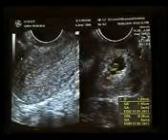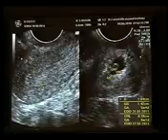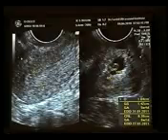This was a case where the uterus is normal, but the pregnancy is actually located within the cervix. It was a cervical ectopic pregnancy. Sometimes an aborting sac in that location may resemble a cervical ectopic pregnancy, but in those cases there will be no Doppler blood flow and there will be a history of bleeding.